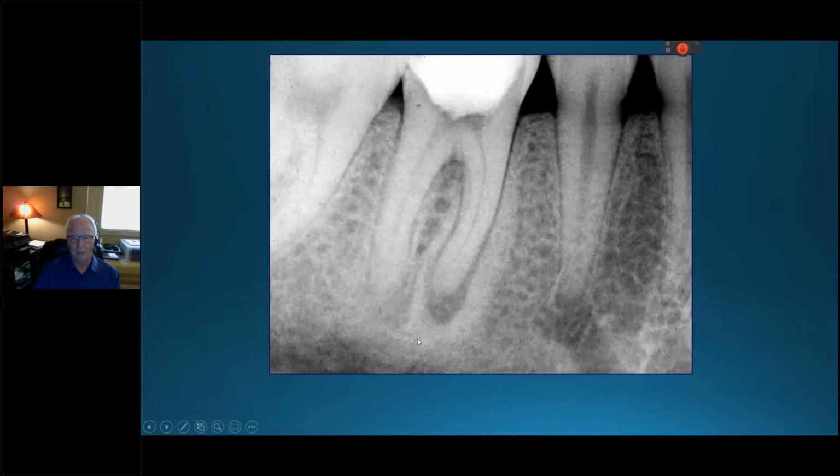When you see a thickened hyperostotic margin, no matter if it's around the end of a tooth or it's in a sinus area or somewhere else, I call this hyperostosis. It should be termed hyperostosis. It means this has been a long-standing problem. The chances of this resolving are highly unlikely. You'll never get back to normal health because this is dense bone now being laid down to try to wall off this infection. But this would respond to root canal procedure if done properly, of course.